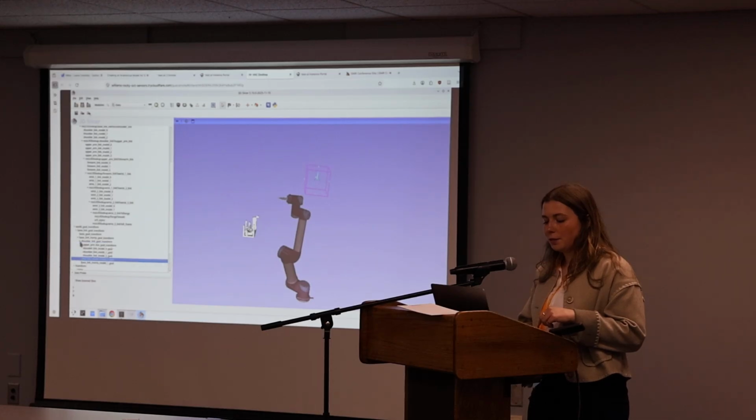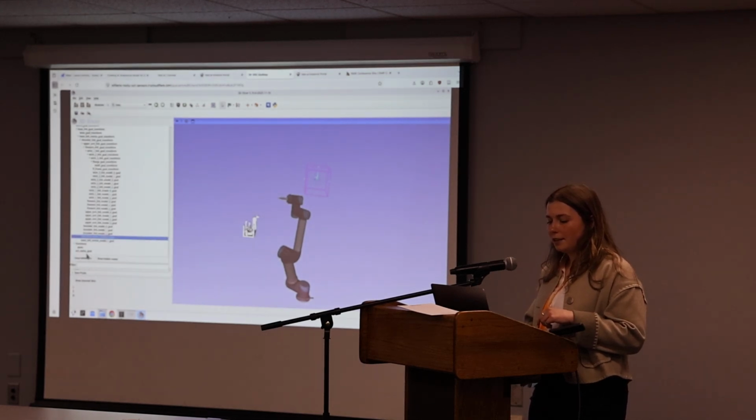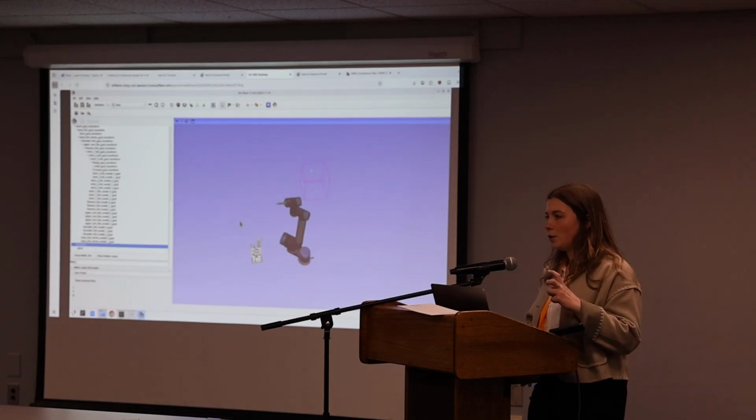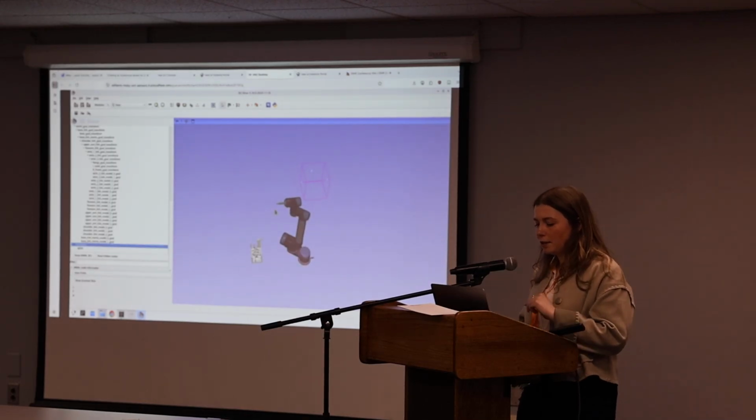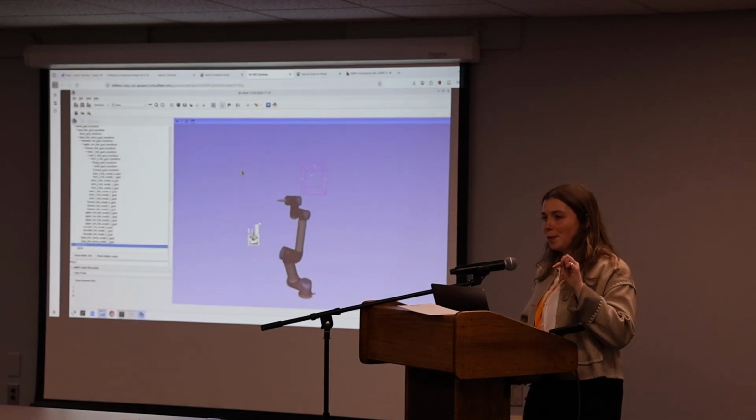So extend the whole transform tree, and in this case, the transform tree is a little bit different, but you want to take this UR stylus goal and add it onto tool 0. And that's on the, we call it a ghost robot or your goal state robot, but there's a little end effector there too. So now you have something you can actually point at stuff.